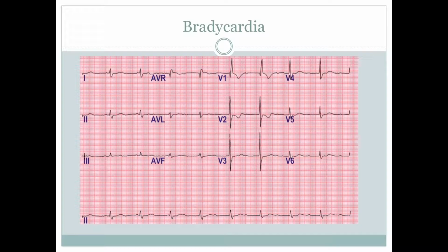So sinus bradycardia is pretty simple: it's anytime you see that the rhythm is specifically sinus, so the P wave is coming from the sinus node and it's regular and everything's fine, there's no blocks or anything like that. And then the other thing that you have to worry about is any kind of AV block. So this is actually a patient that has Morgagni-Adams-Stokes attacks preceding the development of a persistent complete heart block, and this is kind of what it would look like.